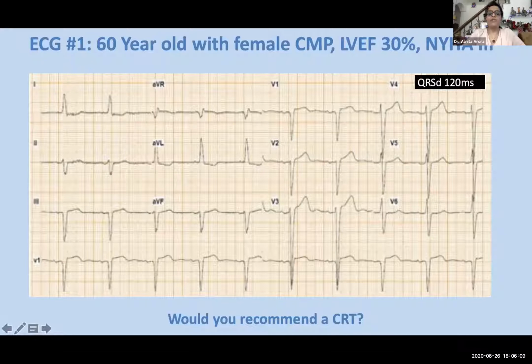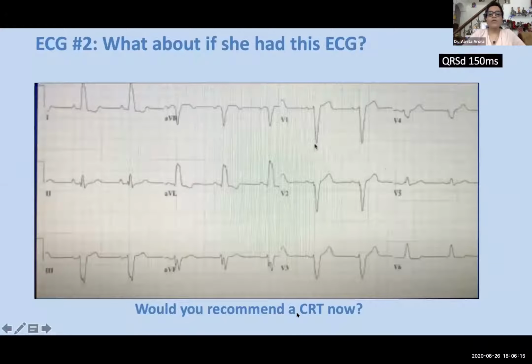Okay, so most of us believe that CRT is not recommended in this patient. What about if this patient has this ECG? Kindly give the poll again. What about if this ECG is there?